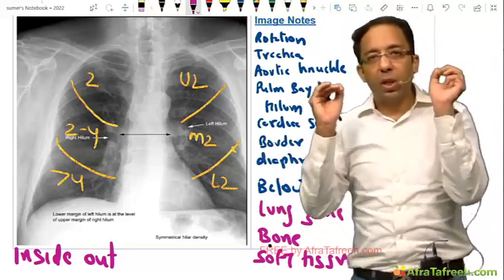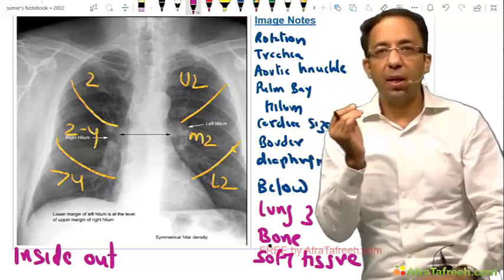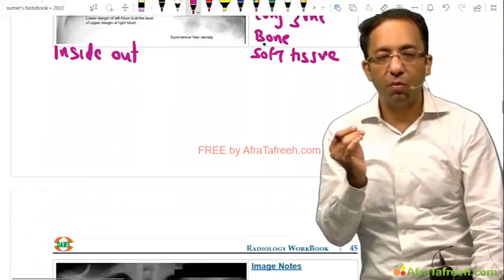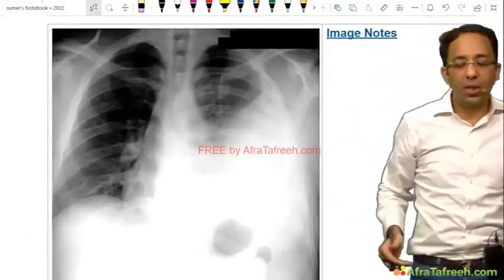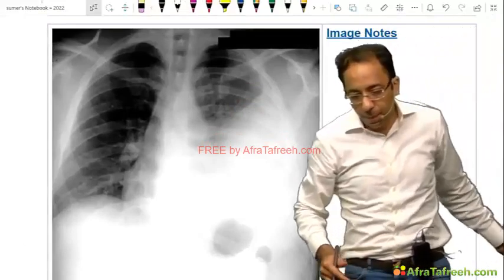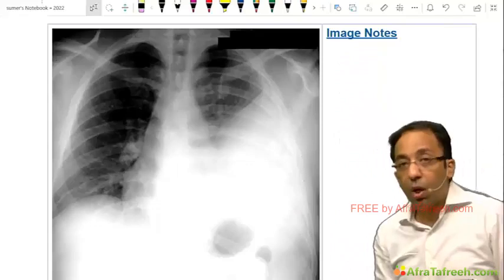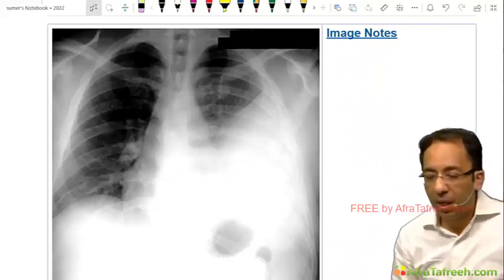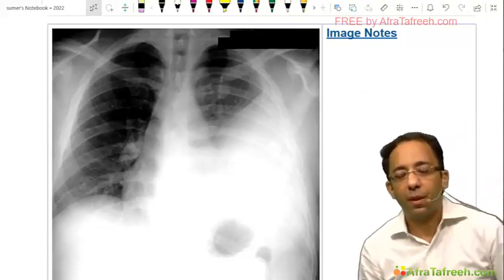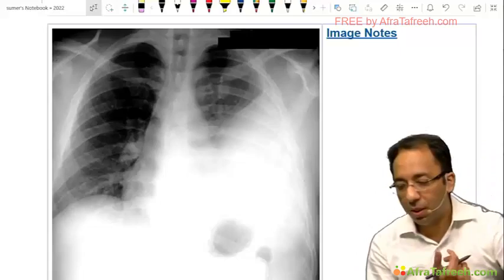Now what I'll do is, I will ask you to gradually start to learn tiny bits of diseases. Okay, we'll start to see some disease together. I'm giving you an X-ray to evaluate. I'm asking you now to look at an X-ray and tell me. Anybody now? Tell me.